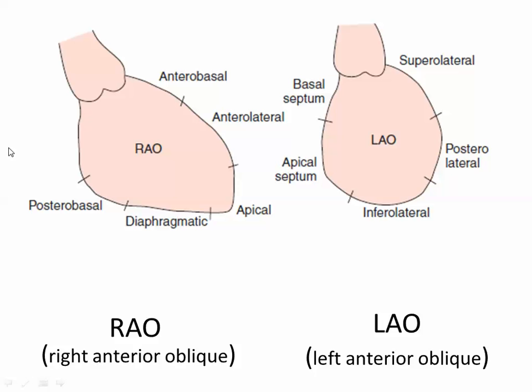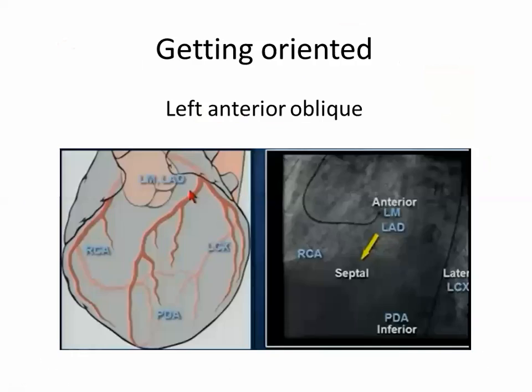Revision. This is RAO, so this will be anterior, posterior for the aorta. Okay. What's the importance of this? It will be important in the anomalous, to know the course of the anomalous artery. It's malignant because this is the aorta. Where do you suspect the pulmonary will be? Anterior to the aorta, so will be here. As we said at first, the pulmonary artery is the most anterior vessel.